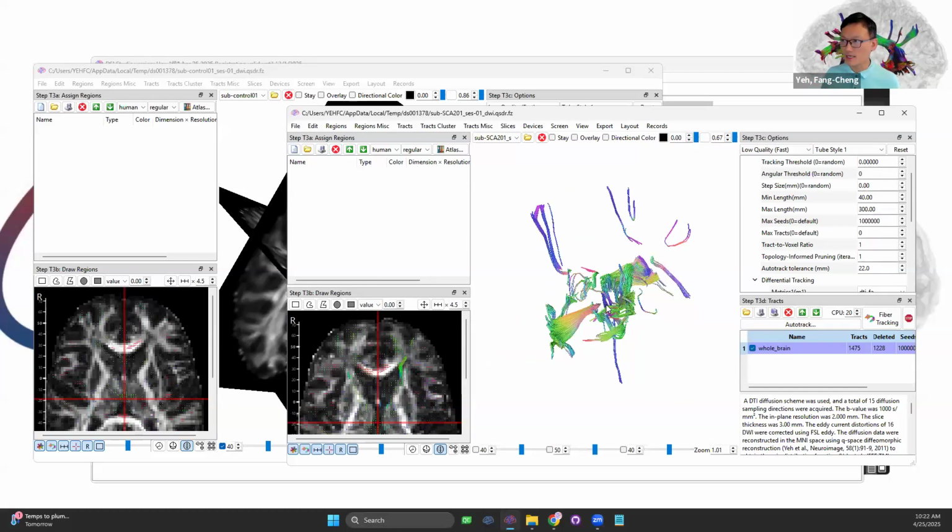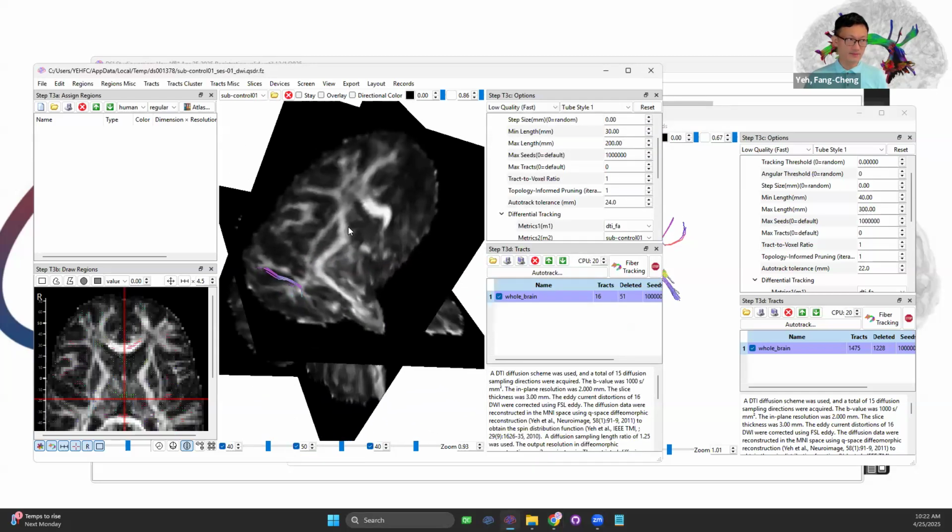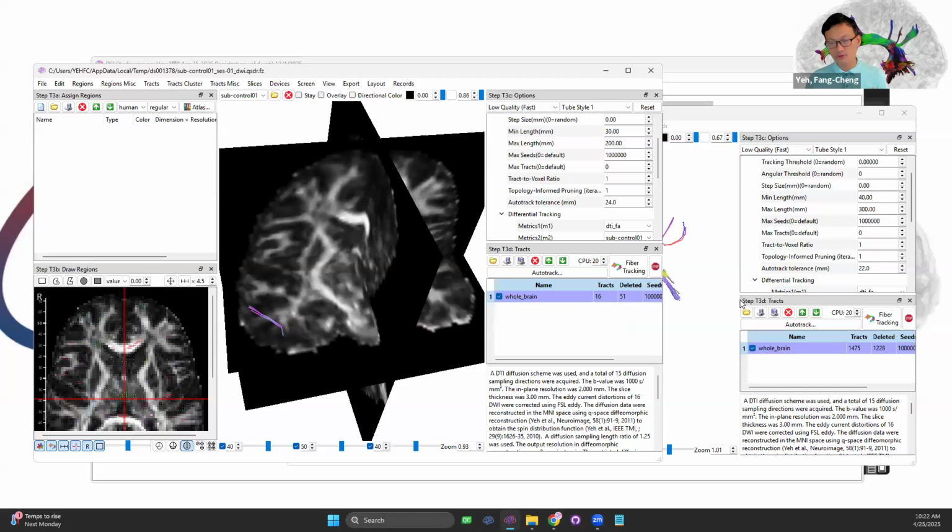And if you are doing a study, then you need to apply the same for all the controls and all the patients, and get the average finding. So the average volume of the finding in patients, and the average volume of the finding in controls, the ratio will be your estimated false discovery rate.